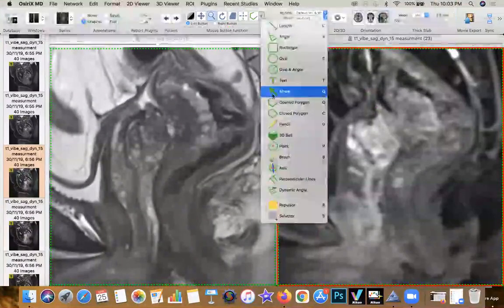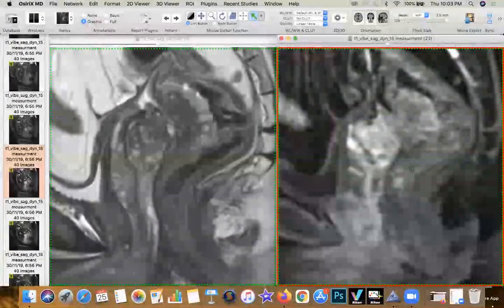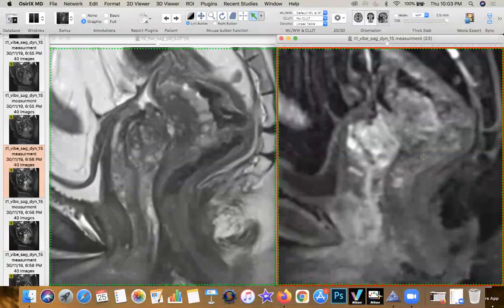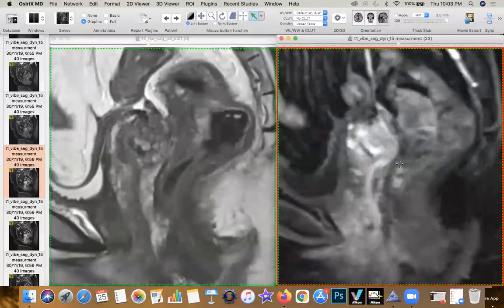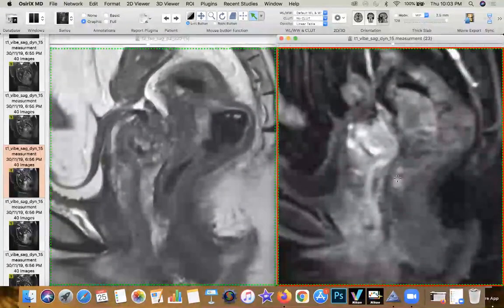And this could be a sign of, not recurrent disease, but multifocal disease, which is affecting more than one segment of the same bowel loop. So it could be rectum, it could be colon, it could be anywhere. But multifocality is two or more sites of involvement in the same segment of the bowel loop. So you need to be very careful that you don't miss tandem or skip lesions.